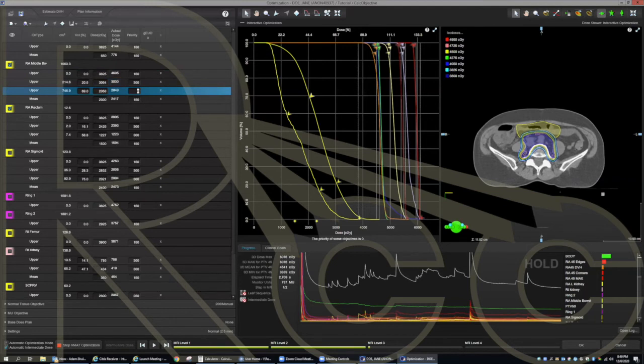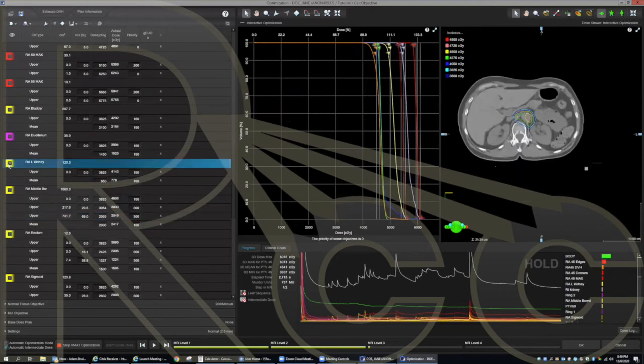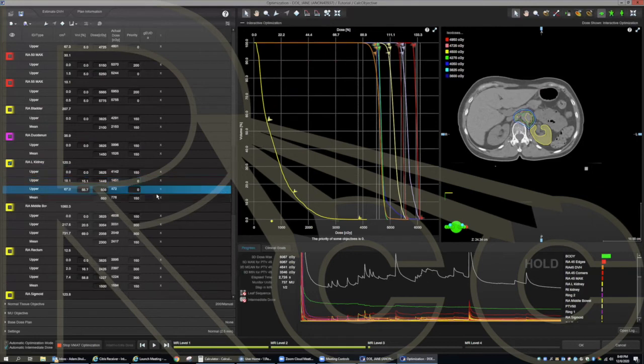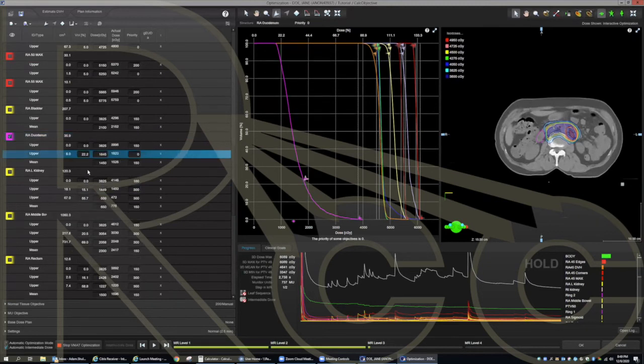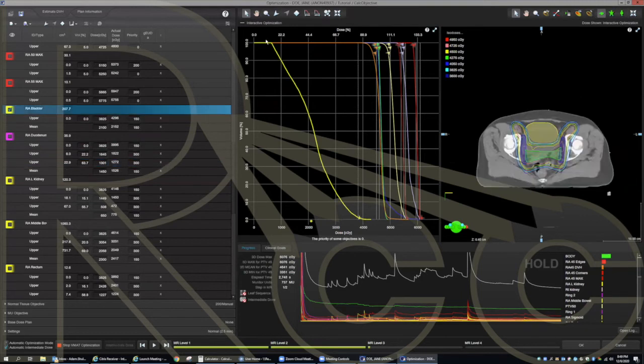I'll lock this one in. I'll lock this one. Okay, almost ready.